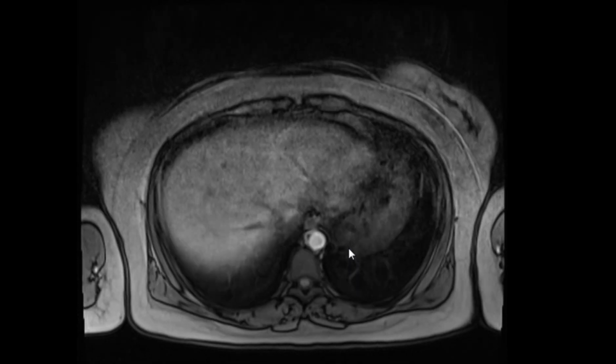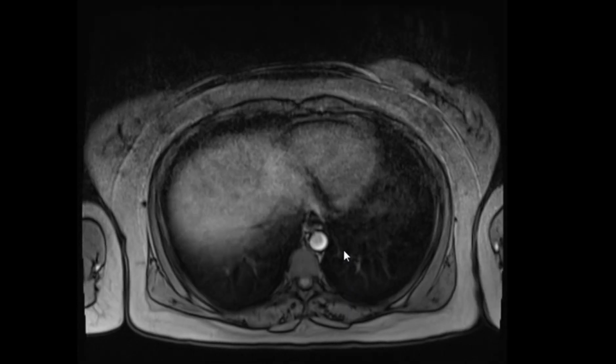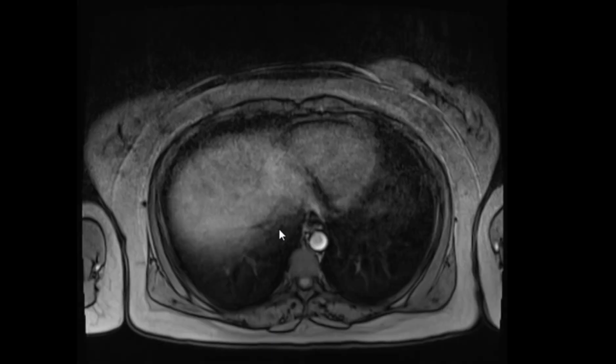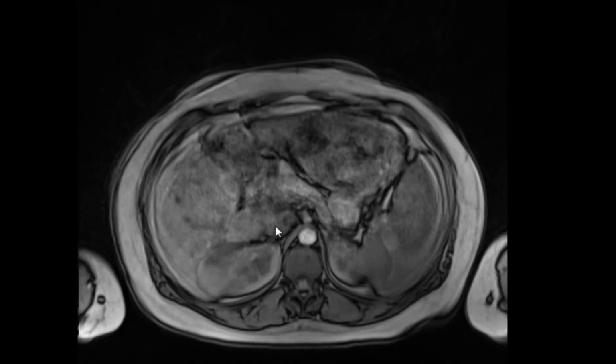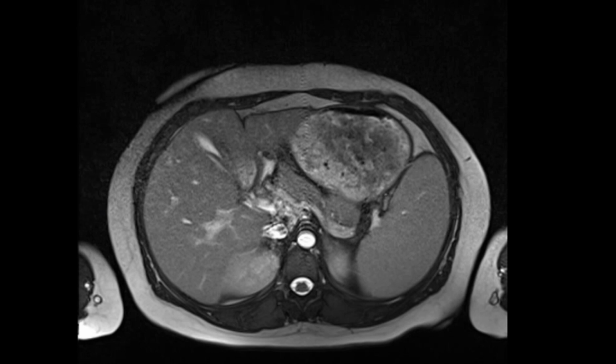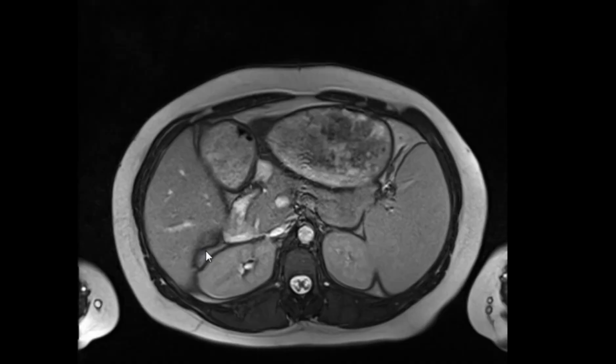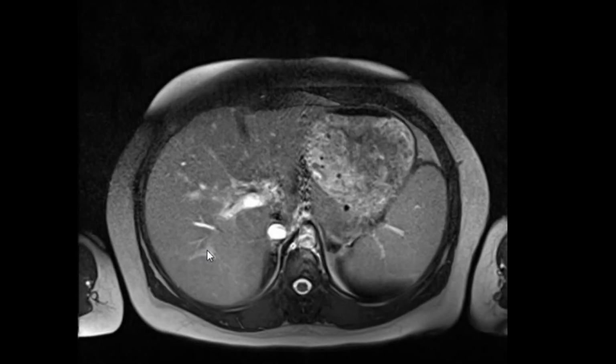Second, what are the radiologic features of gastric outlet obstruction? Distended stomach. Distended with what? Fluid. Okay. Is there any fluid in the stomach? No. Fourth, what are the clinical features of gastric outlet obstruction?